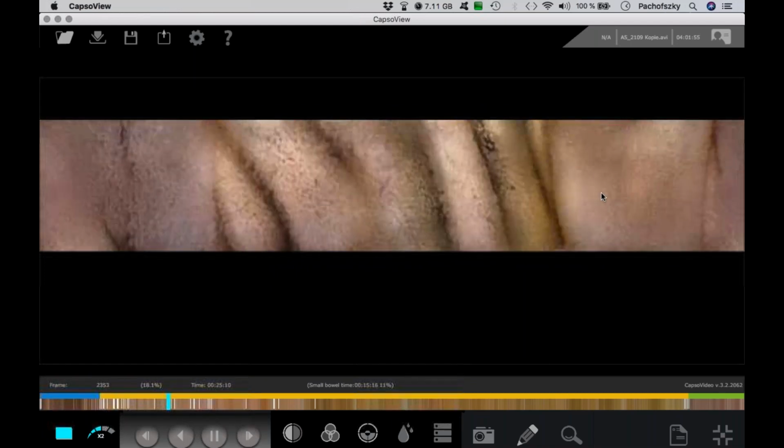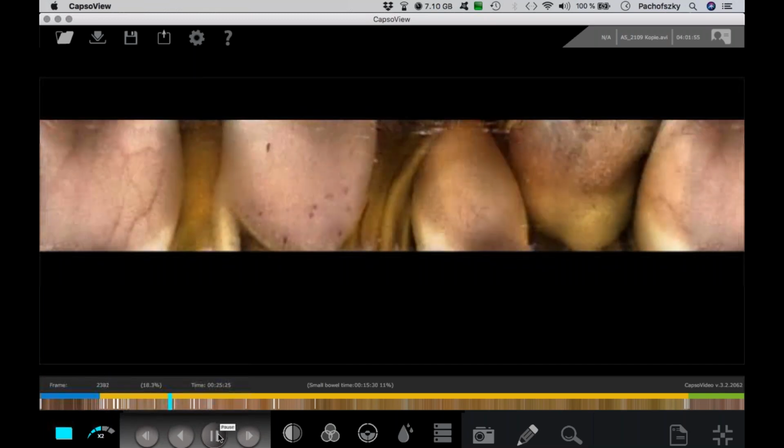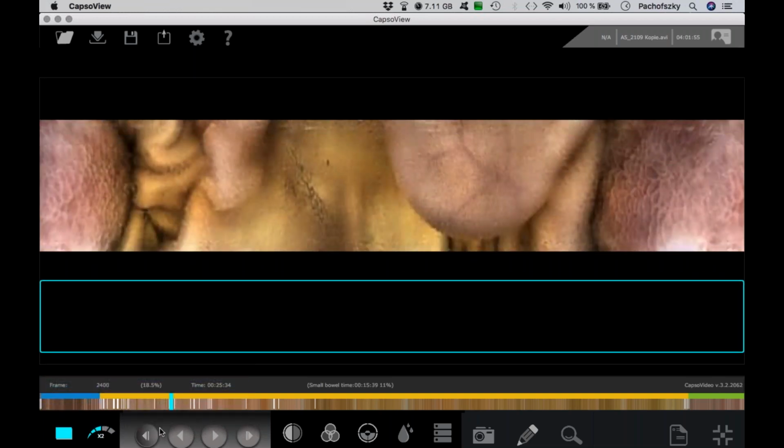Here also a big lipoma in this area, and here, if you look at this, it's looking a little bit different. It's also a submucosal mass, but we don't have those flattened villi.